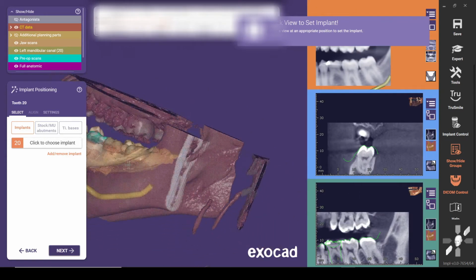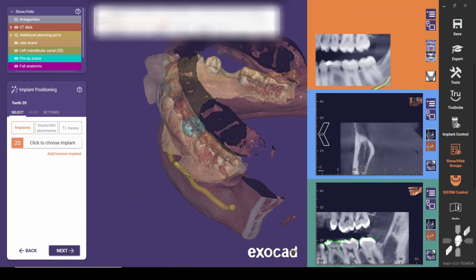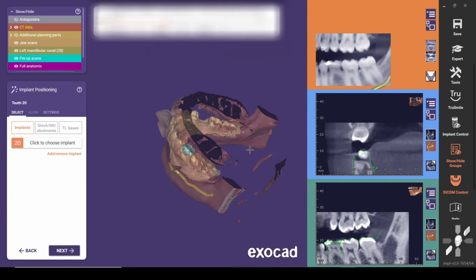So just as a review, find that digital wax up there. Okay.